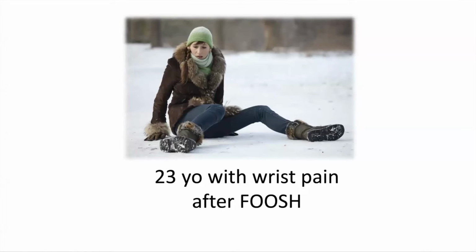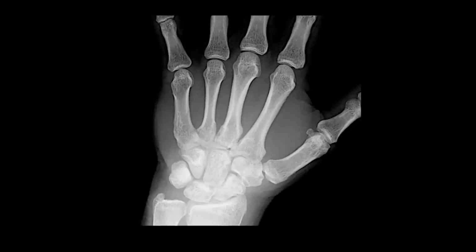All right, we're getting into wintertime. Things are getting slippery out there. This lady comes in after a fall on an outstretched hand. This is an AP view of the wrist. Again, at first glance, it doesn't look that exciting. Her alignment looks pretty good. The bones, I'm not seeing anything super obvious jumping out at me.